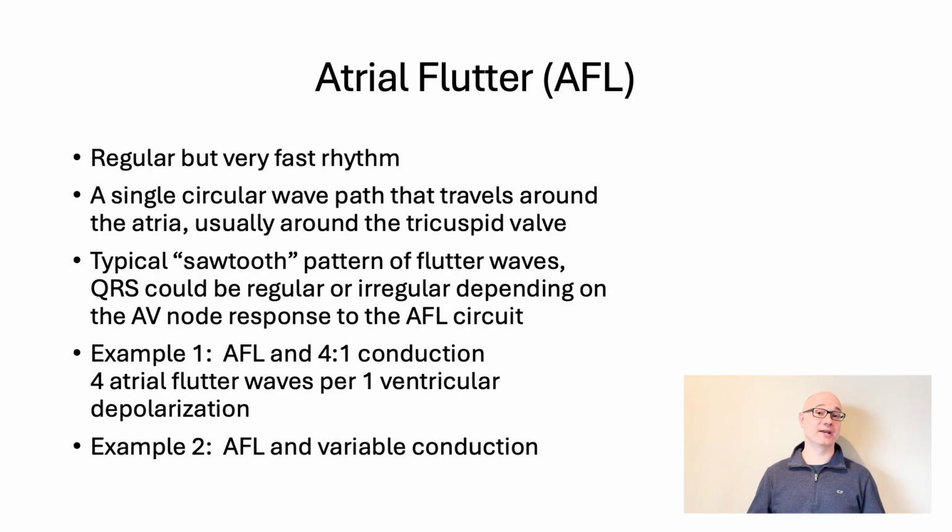Okay, so now let's talk about atrial flutter. Atrial flutter is related to AFib, but it's a little different in that it comes from a circular rhythm going around usually the tricuspid valve in the right atrium.